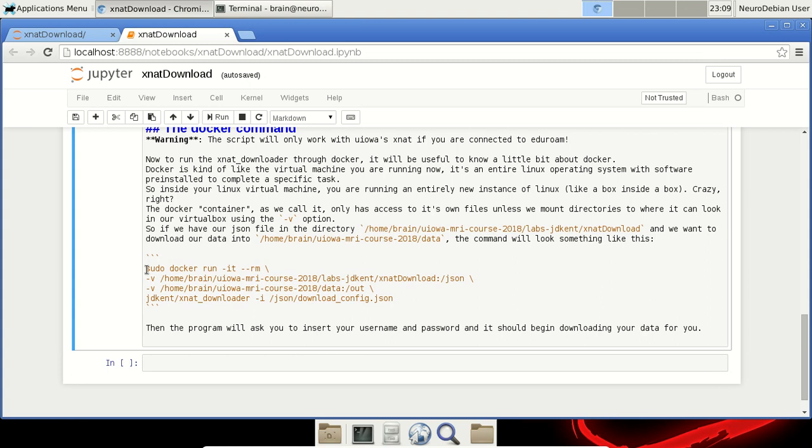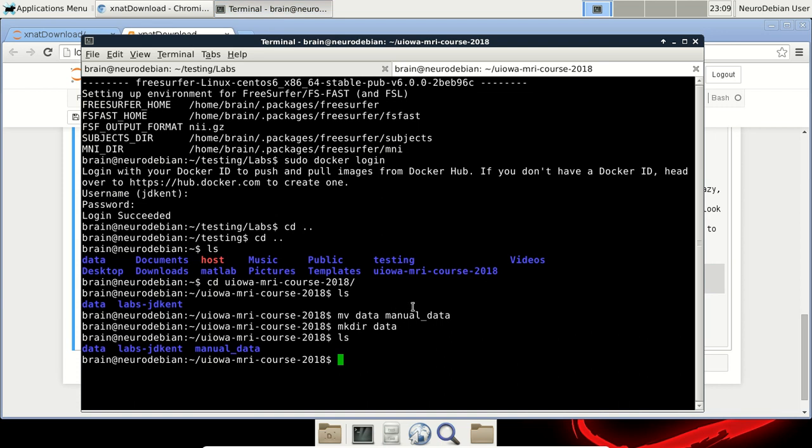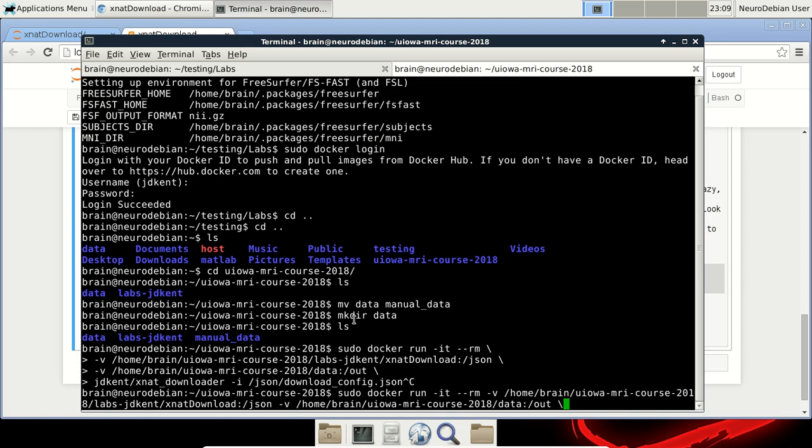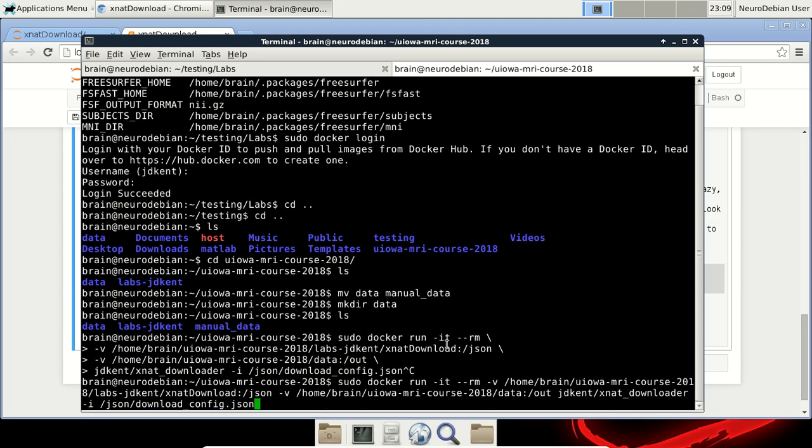So I'm going to select all the code here. Then I'm going to paste it into my terminal, again with Control-Shift-V. I'm going to hit Control-C so I can edit some of the information that I've put out. That doesn't copy everything, so I'm going to select this last line here, Control-Shift-C, Control-Shift-V, to get that last line of information.